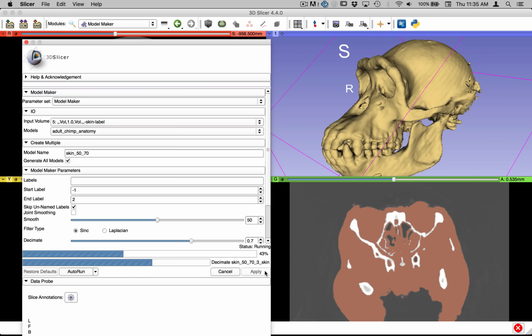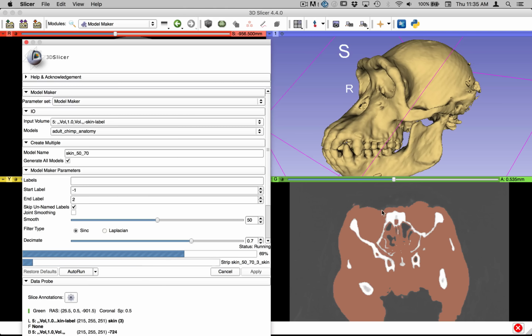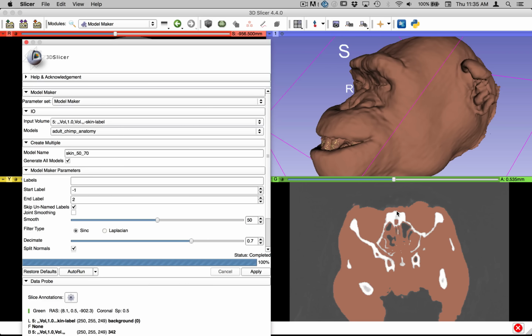You can see that this one is taking longer. There's much more internal structure for it to bring in. If we look at the map here, you see it's got to pick its way out around and in between all the bones. And this makes for a very dense mesh. In some ways, it would be better just to capture the outer shell. When I've tried to do that though, we get some bad geometry.